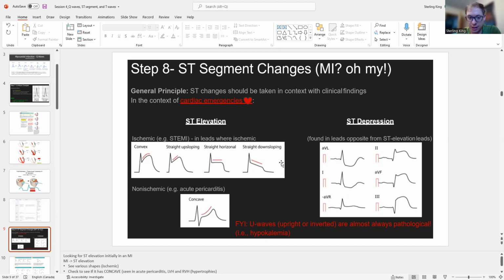a heart attack. The other thing that you're trying to look for is the reciprocal changes in two contiguous leads. So aVL and 1, those are both the left side of the heart, and they're higher up on the chest, versus say aVF, 2, 3, those are all on the bottom side of the heart. So if you're comparing the two, and you're seeing ST depression up here and ST elevation down here, what it means is that there's an inferior part of the heart not getting blood. So that's an MI.